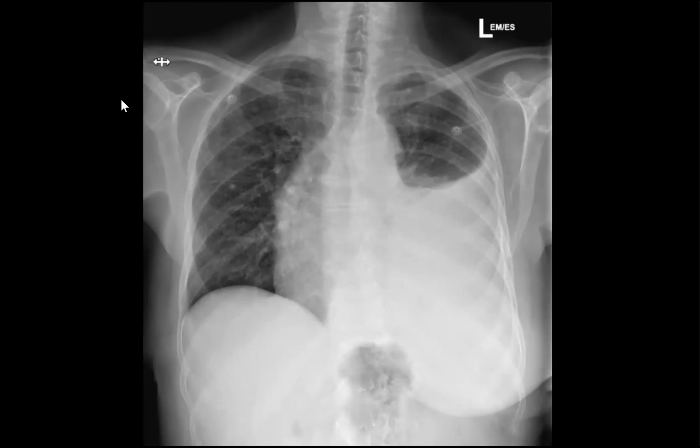This is the frontal chest radiograph of an adult patient. There is evidence of near total opacification of the left hemithorax with a mediastinal shift to the right side. The visualized upper lobe of the left lung and the right lung appear grossly normal. There is evidence of upward curving of the opacity, suggesting pleural effusion in this curve.